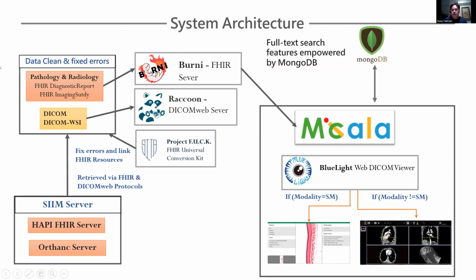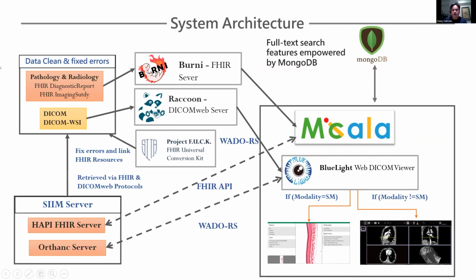Because we implemented it in a standard-based way, we can just configure the DICOM server endpoint, so we can retrieve images from any DICOMweb server. We can change the configuration to switch to retrieve the data from the SIIM server.